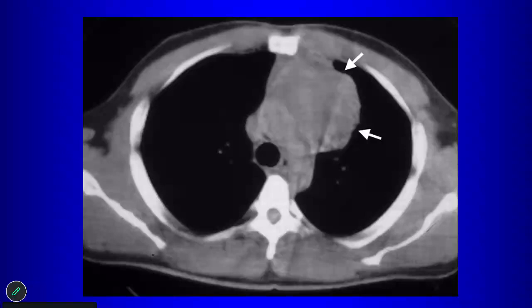Looks like a young male patient. Yes, because it's a male patient. The malignant germ cell tumors of the anterior mediastinum do not occur in females. But in a male patient, if you have an aggressive anterior mediastinal mass, in addition to lymphoma, you might also consider a malignant germ cell tumor in the differential for that. Okay. This was a thymoma.